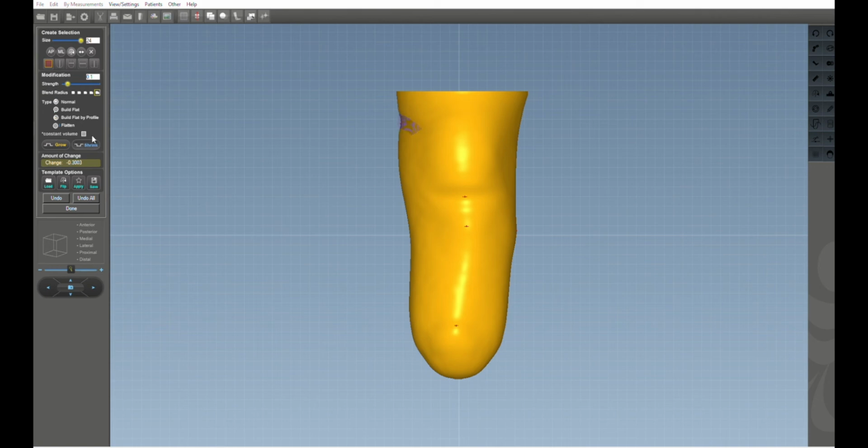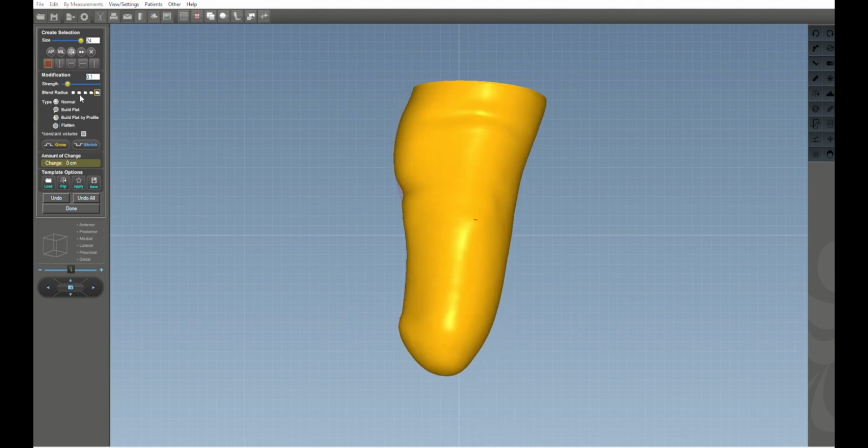Okay. Now I'm not really thinking I'm going to have a great amount of suspension here. I just want it to be nice and neat. And I want to put it on the other side as well. Less on the lateral, of course. So that kind of takes care of those options. Finally, fib relief.